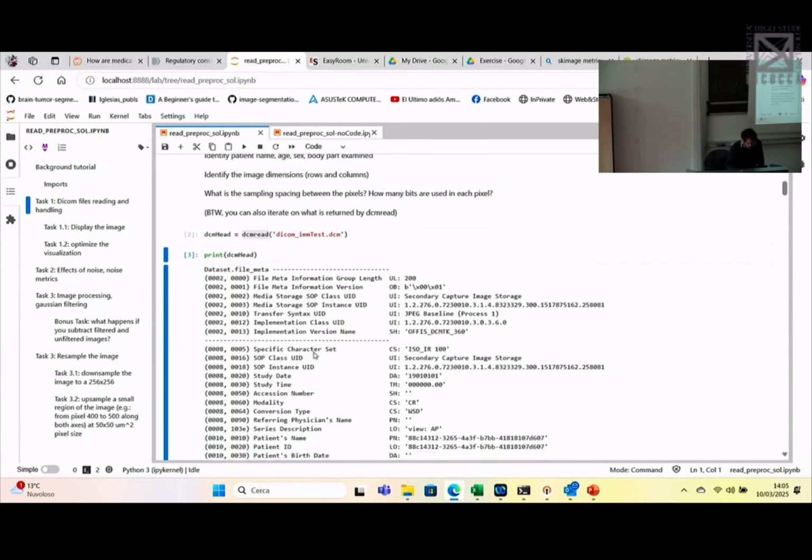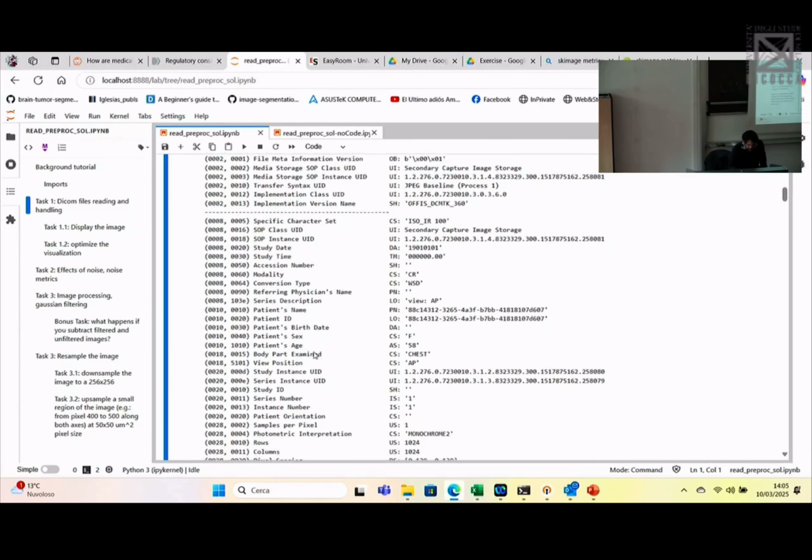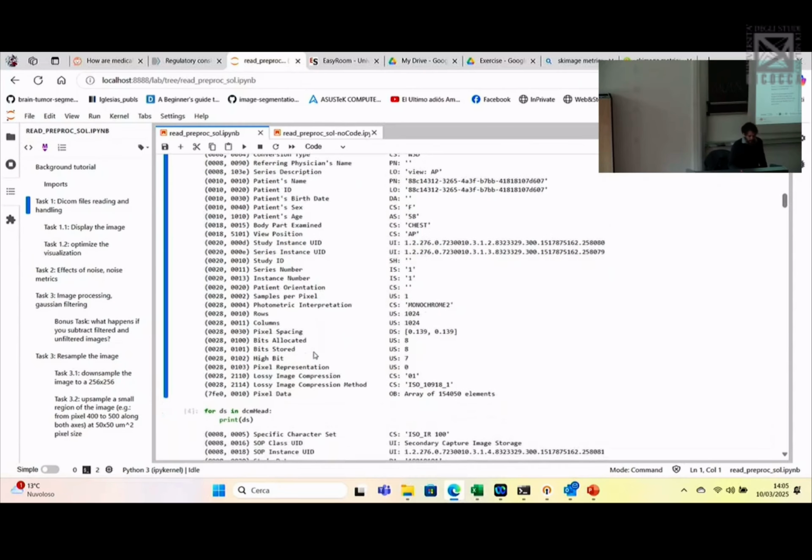And now I can find it here because it has been already pre-processed, but sometimes they also tell you the technical parameters of the acquisition, if for your study it might be relevant. We don't care for the pneumothorax, but now I'm working, as an example, on a project on image standardization for a modality that is very acquisition dependent, and extracting all the technical parameters from the DICOM headers is pretty useful.